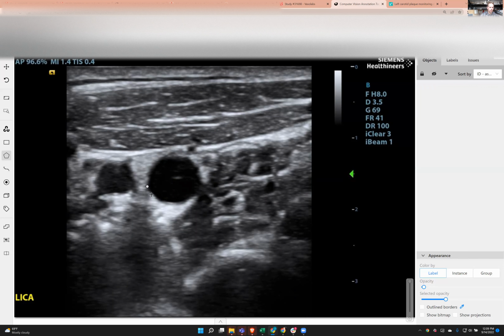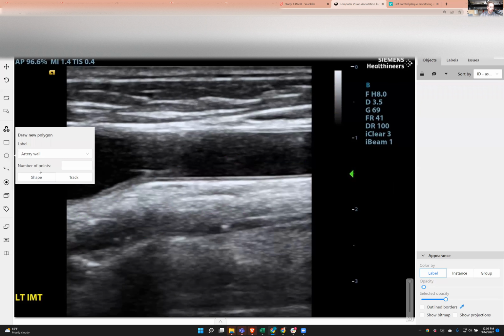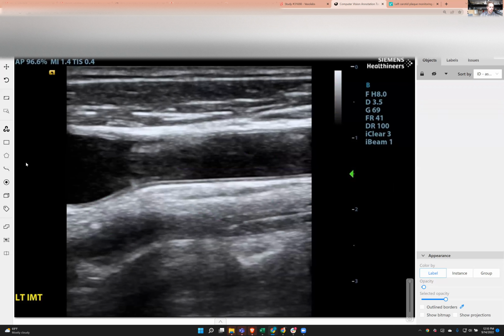Show it's open. The reason I do this is to train the computers to see the artery. Putting this on a probe so that it would assist you in real time is my goal. Everybody should have access to these tools. All right, let's do intima. Boom. Next, forward.